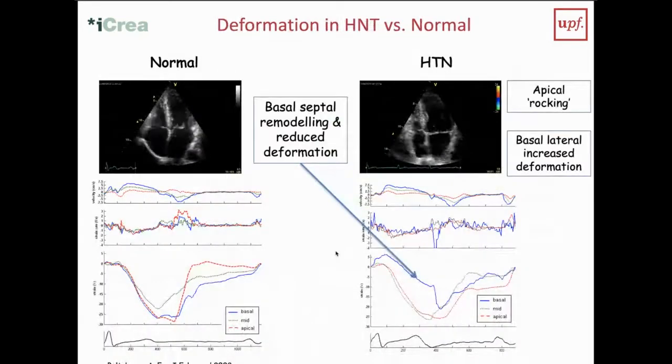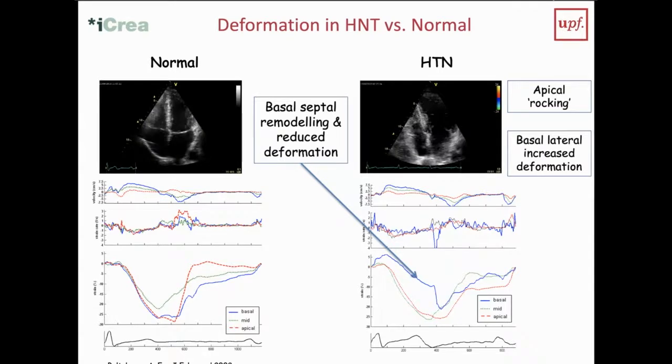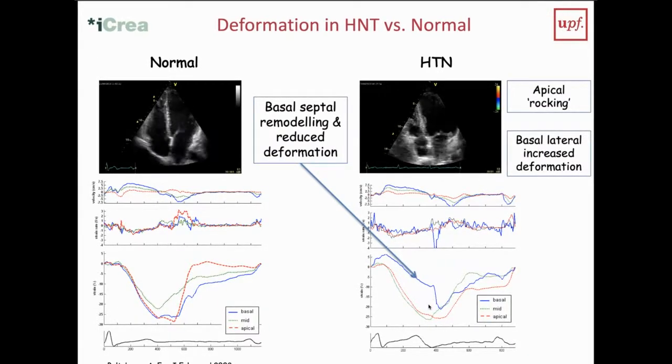And you can actually start thinking about, okay, why do you get hypertrophy? In this case, it's because of pressure loading. You can infer that if you have pressure loading, you have this very localized thing. We're not going to go into detail on why, but because of this, when we look at deformation patterns, you start to see very abnormal deformation. While deformation is normally homogeneous through the wall, it becomes very inhomogeneous. So this way, you can really look at different patterns and then think about the pathophysiology. So this is what you can infer.